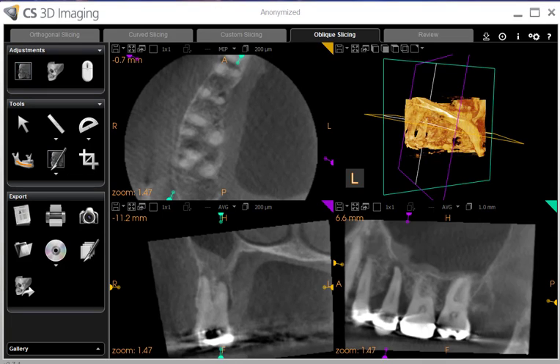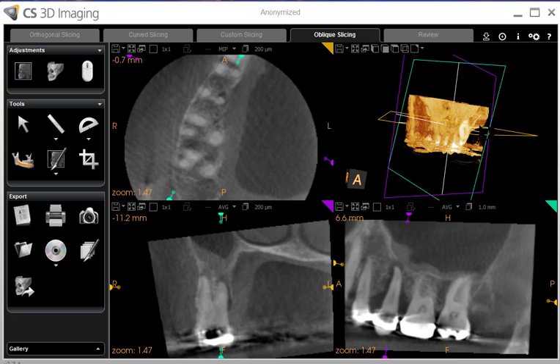I'm going to illustrate how I use cone beam CT and the three-dimensional images generated with that technology as an aid in diagnosing a fracture or cracked tooth. This is a typical 3D small volume scan taken at 200 microns. That's the minimum width of the slices.